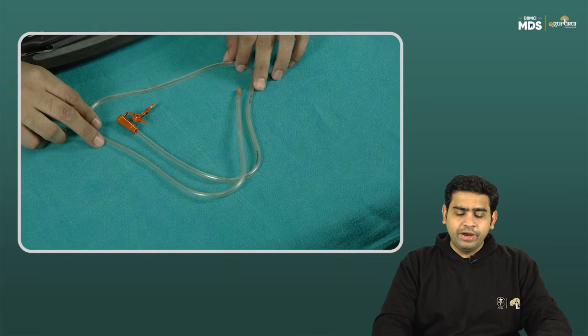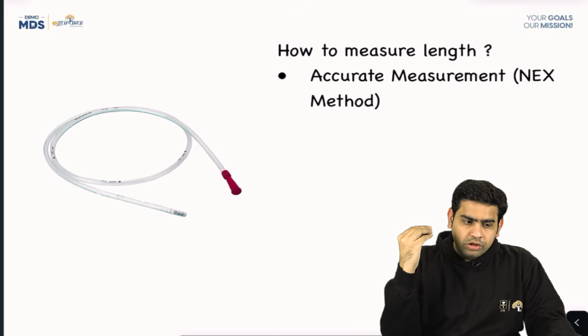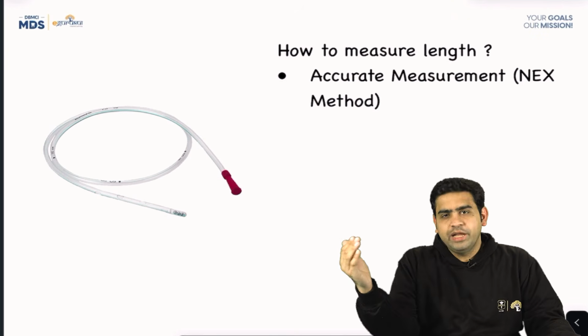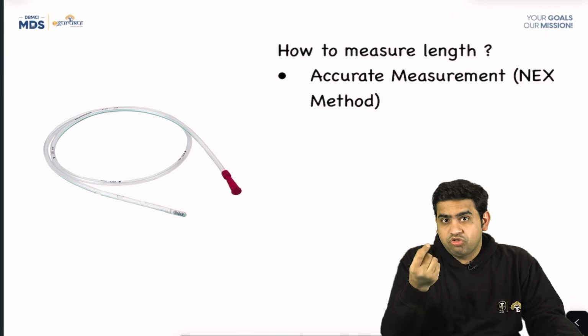I'm pretty sure all of you would have seen this at one point or the other. Now, my question to you is, why do you put this? What is an indication of putting it? There are multiple indications of putting it. One of the important indications is nasogastric feeding.